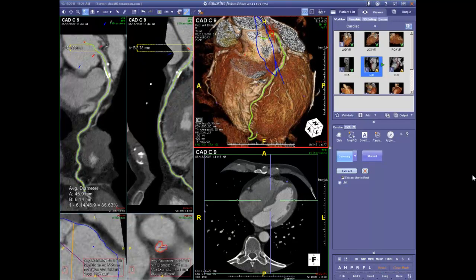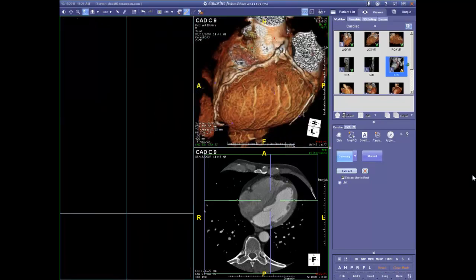And what about this left anterior descending here? I think that looks good. We've got the apical wraparound vessel, so it was more successful this time than that time, but I notice that this diagonal doesn't appear to be connected anyway, so we'll experiment with that to try to answer one of the earlier questions. I'll go ahead for the time being and validate that view of the left anterior descending.